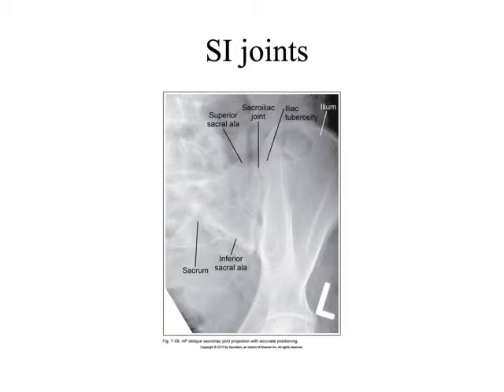What's another way that we might describe what we're seeing on this image? Any other ideas? I mean, really, it's up to y'all. Y'all tell me.